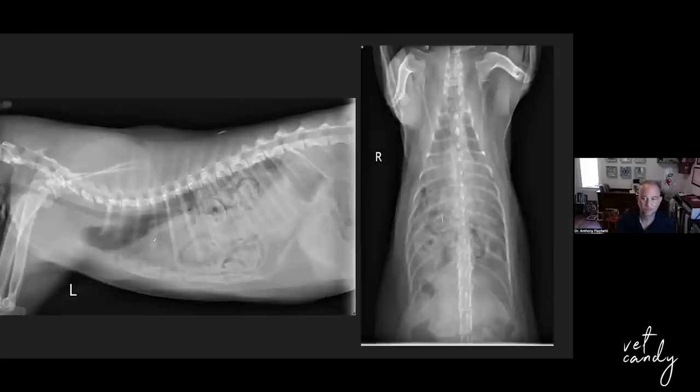Oh man, I hope you guys are all looking at this from home and can figure out that this isn't normal. This is a diaphragmatic hernia. You can't really see the cardiac silhouette. What are fecal balls doing in the chest? This is the colon being displaced cranially.